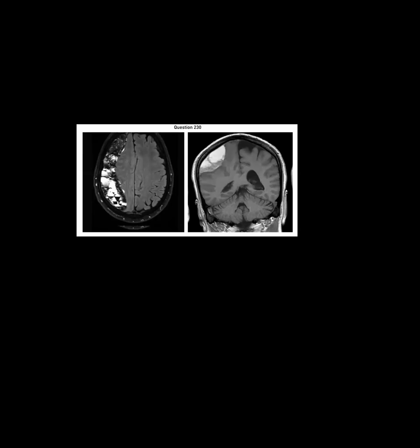All right. And I saw them showing a few different types of parenchymal and extra-axial hemorrhages on MR imaging. If you look at this case over here, this is obviously going to be a subdural collection because it crosses the sutures and then stops at the midline. Same thing over here. Dr. Zhang, how would you age this? Like, what do you think?